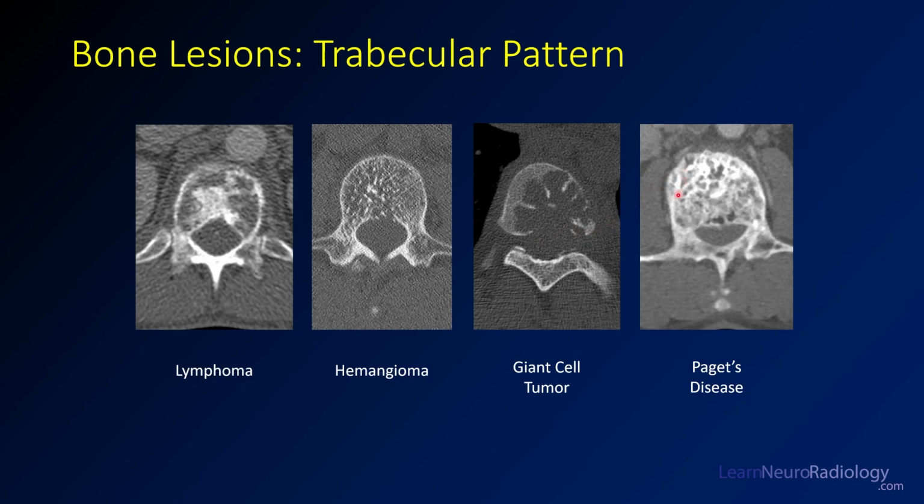Finally, in this fourth CT image, you see a lot of dense bone. A feature that you might see is thickening of the cortex here, thickening of the cortex in other locations with bone deposition. This is Paget's disease, and so new bone formation and thickening of the cortex are characteristic of Paget's disease. So think about on CT if this pattern can help you refine your differential diagnosis. However, you're not always going to be able to tell, and as I said, you may have to resort to biopsy or surgical resection to actually get the final diagnosis.